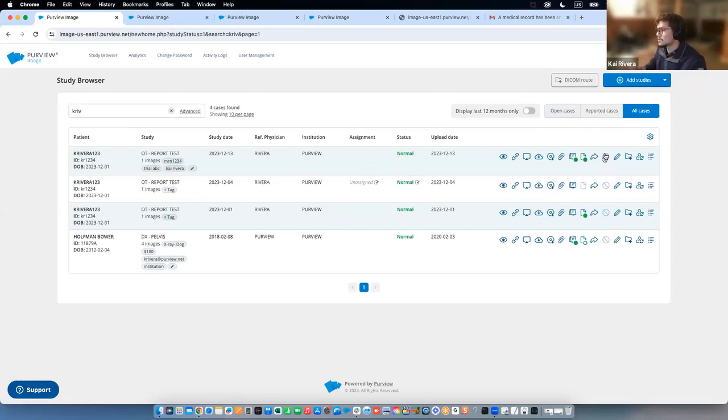So there's a feature that's being looked at that will allow an administrator to essentially unmark it as read so that the report would be available for creation, essentially. So it'll revert it back to an open case. That's a good question. That's something that we've gotten some feedback from, and so we're looking into it currently.